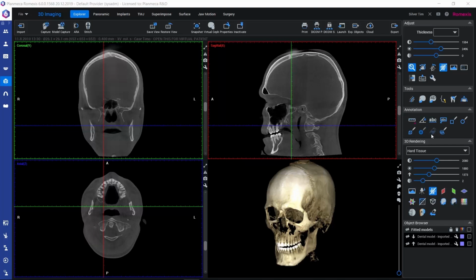So firstly, we have this region grow tool that we're going to cover in this tutorial, and this we can use for segmenting, assisted by the software, anatomies that have a clear difference in terms of grayscale values with the surrounding anatomy. This other tool, manual segmentation, we can use for segmenting anatomies that don't have that clear difference with the surrounding tissue, so that the software is not able to recognize them well. So let's focus on this region grow tool. Let's see how this works.